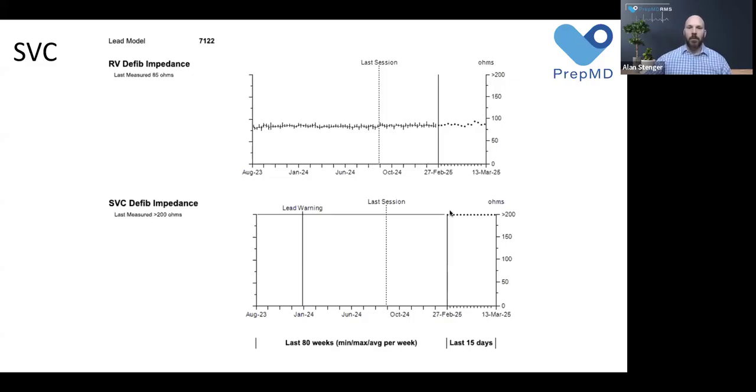So very, very good. Are we concerned about lead integrity? No. We're more concerned that we know our patients, know what they have, so that we can discern if we see something like this, is this an acute problem, or is this something that in this case is actually not a problem at all? Yeah, definitely. Definitely good to do your homework on that.